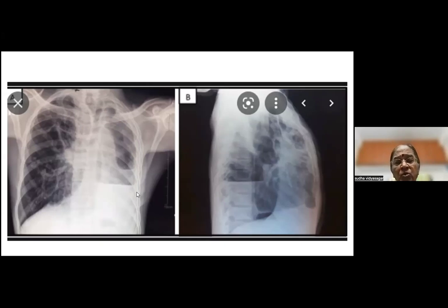All this points to a good amount of fibrosis, and generally pleural fibrosis is much more massive than a parenchymal fibrosis. Putting all these things together, that's why I would probably call it an empyema or a pneumothorax with multiple locules, with a compensatory emphysema on the other side, flattening out the diaphragm and some bronchovascular markings being there. We don't know what that is. Okay, fine. Got that? Right.